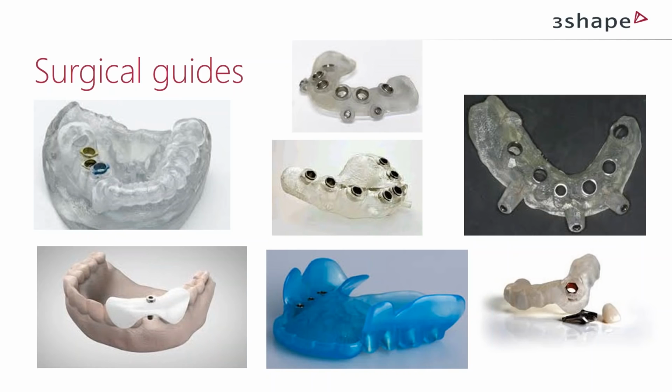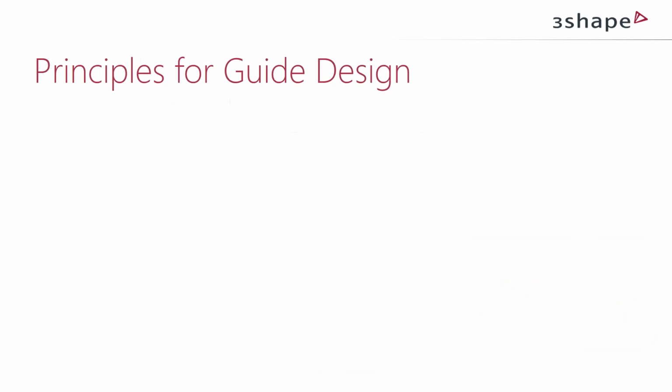But what is in common for all these guides is that the design of them is very, very important. And we'll look at some principles for how to design the guides there. We will start by looking at tooth-supported guides. Later on we will also look at edentulous, but let's start today with tooth-supported.